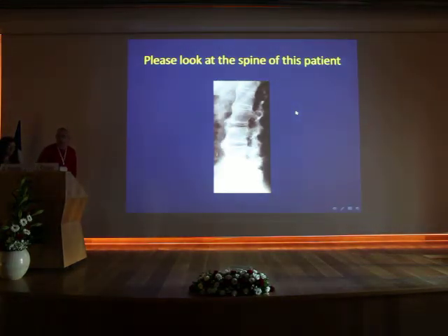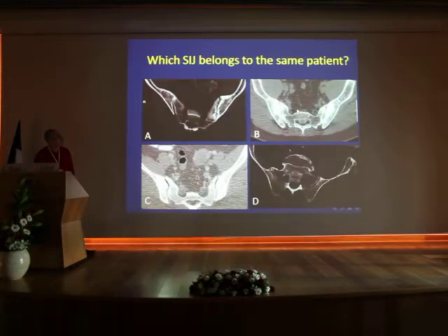So, look at this spine. Iris talked about how osteophytes or syndesmophytes can look. Which sacroiliac joints belong to the same patient? So, look at this.